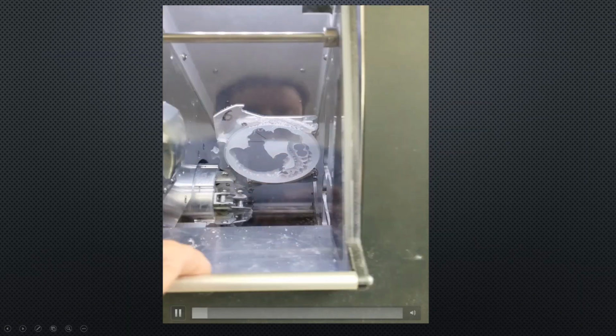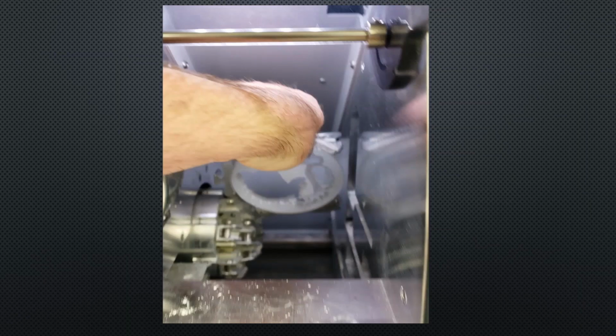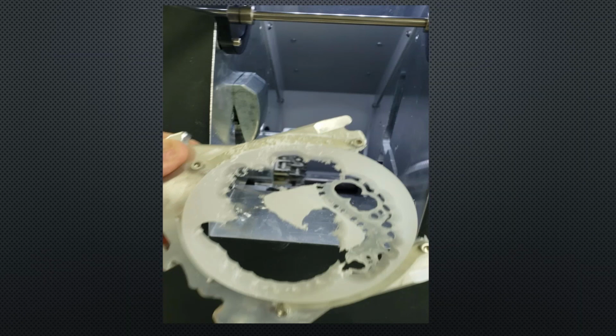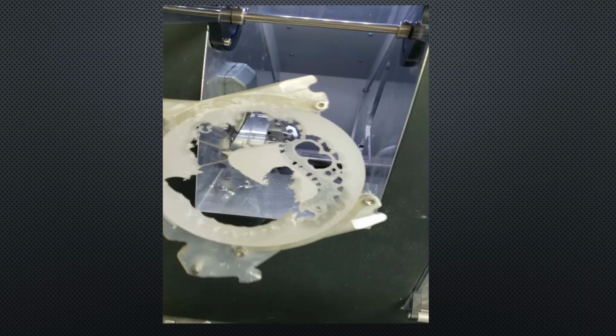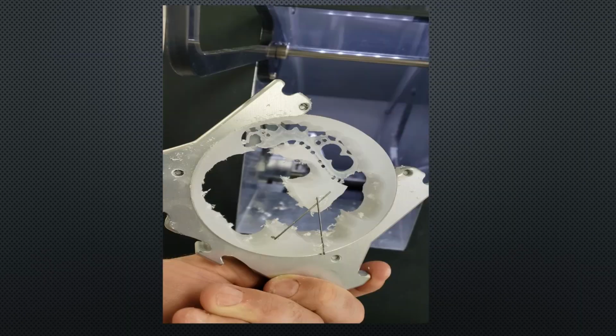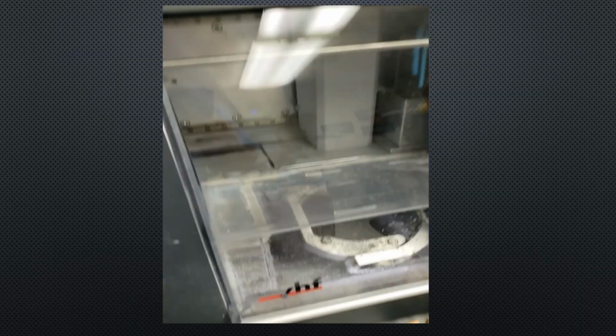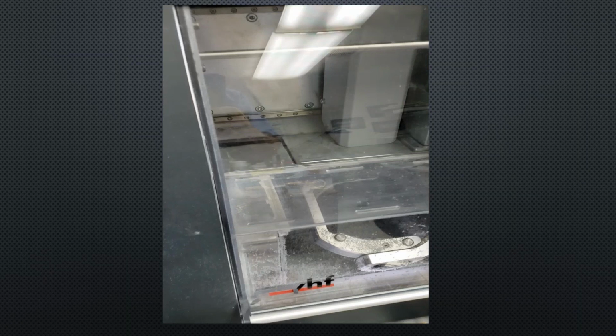And so what I did is, as it started milling, I just used some ball clasps, and I supported that little piece. The crazy glue doesn't stick that great to the material. It's pretty resistant, but it helps to secure that. It'll snap right off because, again, the crazy glue doesn't really adhere to the VisiClear, but it adheres enough to support that little piece. So keep that in mind as you put support pins.